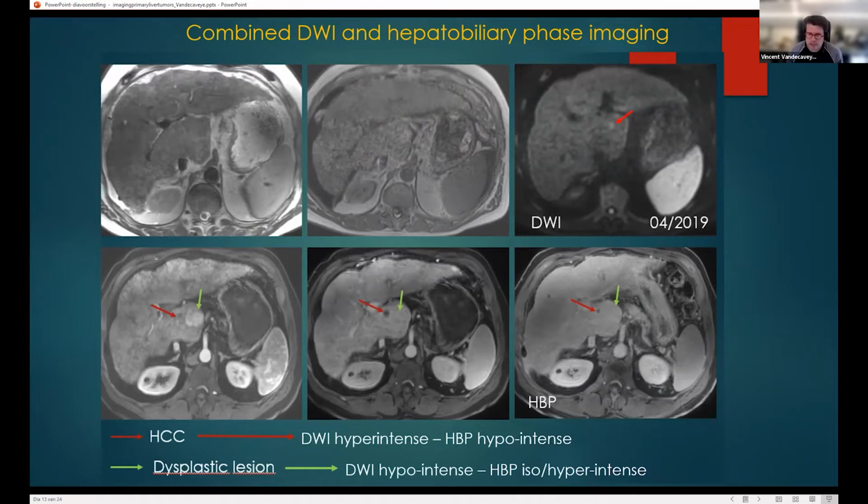So what was done in this patient, the surgeons performed a radiofrequency ablation under laparoscopic guidance, ablated this lesion and confirmed it as a hepatocellular cancer. We asked for a perioperative biopsy of this lesion, and this was a dysplastic lesion. Of course, it's possible that there is a tissue sampling error, but until now, this is already 2 years follow-up. This lesion remains stable in the patient.